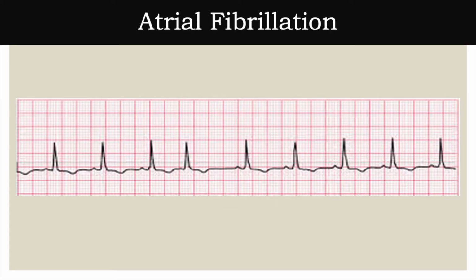All right, so another favorite of mine is Afib. So Afib is also your atriums. So what happens here is that the atriums are quivering. The good thing about this one is that you know that the patient has Afib, because if you could see, the R to R's are not the same.